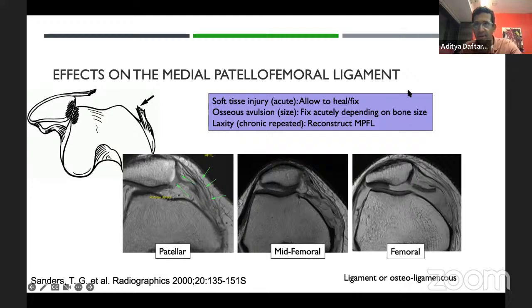Okay. We show some cases of cartilage lesion. So I have shown you some cases of cartilage lesion. I'll try and show you. TT-PCL distance, and where do you prefer it? I unfortunately don't use this much more. So that is one more thing. A few points on how to identify patellar tendon rupture and quadriceps rupture on MRI. Yes, I will show you some of those.